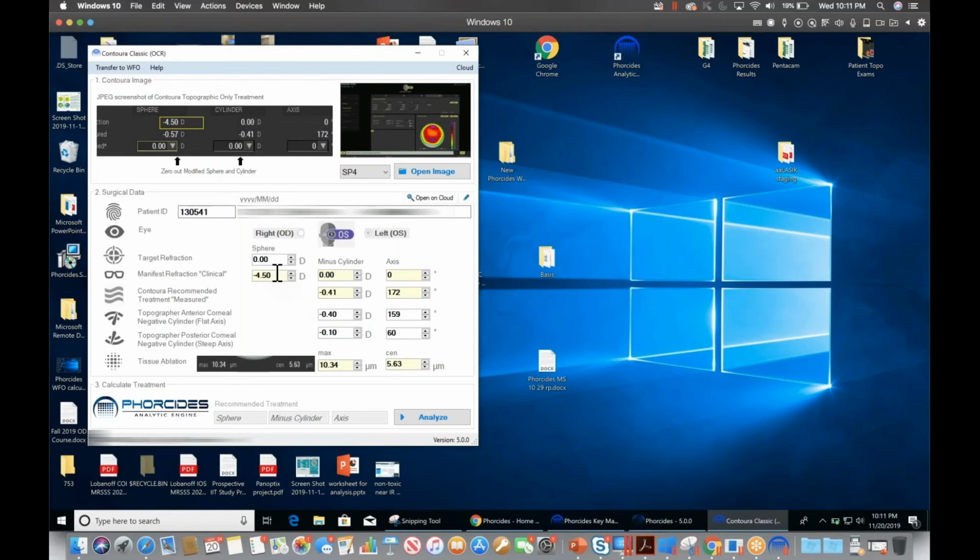And you simply, once you've verified that first box, you hit tab and both jump over. And so we're just tabbing across, confirming that that data is correct. As we get to the white boxes, they're 100% accurate. This data has been pulled directly from the Pentacam or Galilei G4. There are no errors, so I tab very quickly through that.